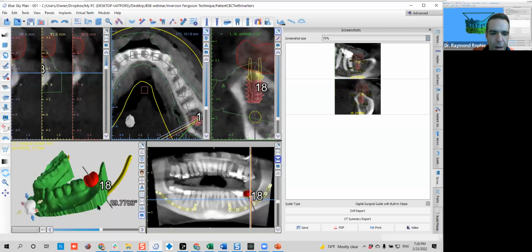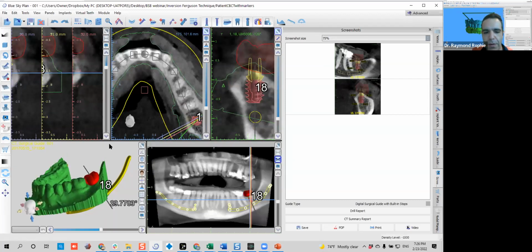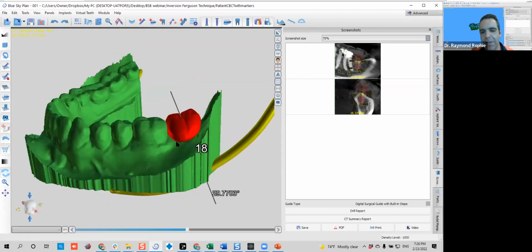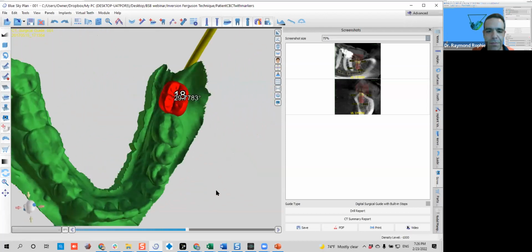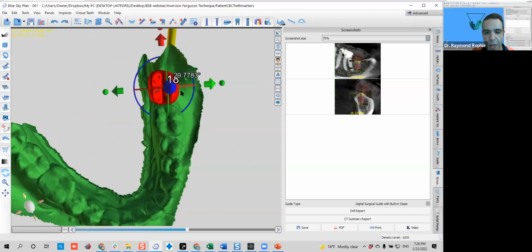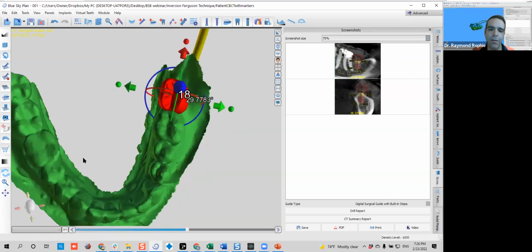Good. There's another way of planning the implants. I've been really liking it a lot, or at least to control the placement or to confirm the placement. I say that it's a very interesting way. So I maximize the 3D view, right? And then I check my crown position. Do I like this? Probably. Yeah, I mean, I can't complain that much. So yes, I'll leave it this way.